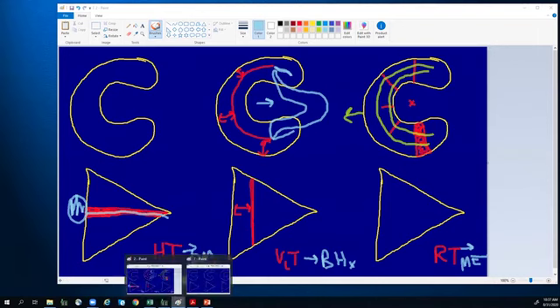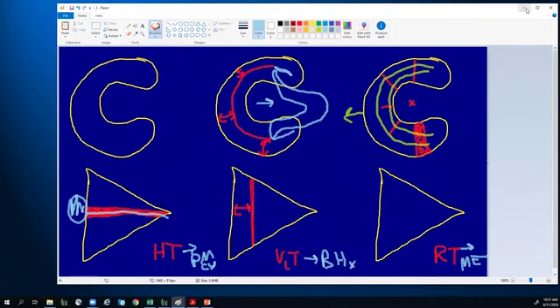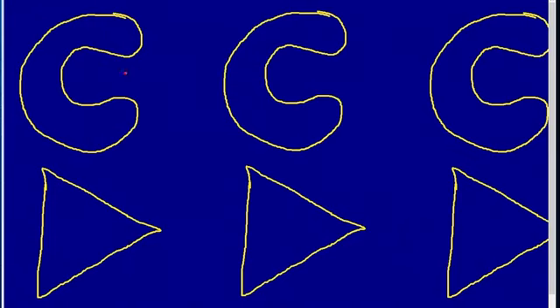I will now move the attention onto some more complicated tear patterns. So I'm going to minimize our little diagrams for the basic tear patterns, and we'll move into some more complicated tear patterns. When I say complex tear patterns, I'm referring to combinations of tears. So imagine that we have a radial tear meeting a vertical tear. Imagine the tear begins as a radial tear and then changes its orientation and becomes a vertical longitudinal tear. Then you are creating this inner flap of meniscal material, which will eventually displace like a trap door.